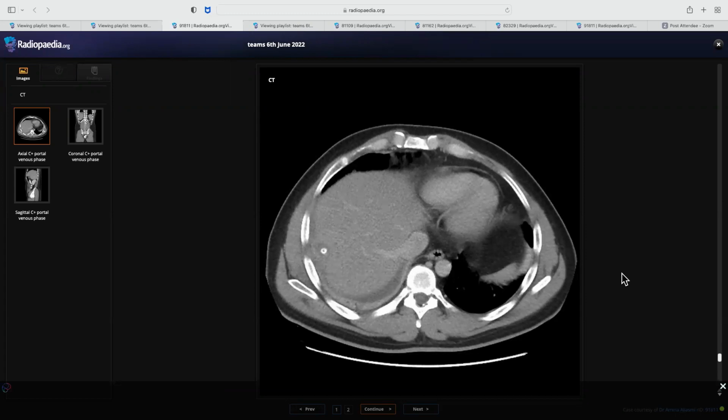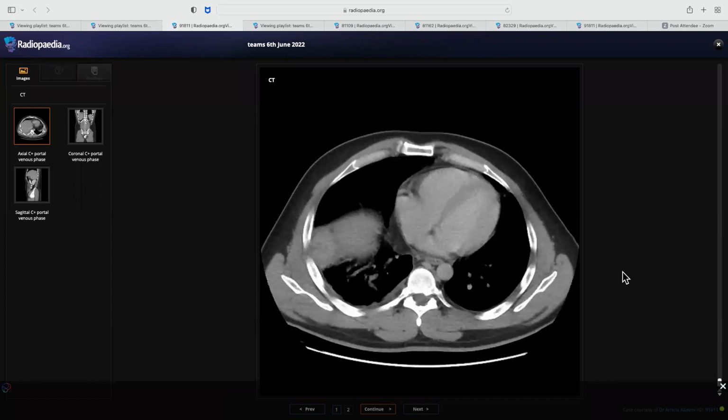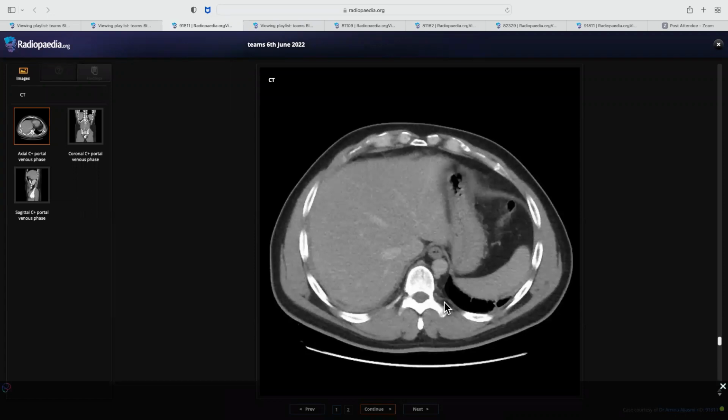So it has an infection. Do you think it's a long structure? In how many sections could you see that? Can you scroll it? You said it's a port catheter. That's what I heard. Part of a tube or catheter. Yes, part of a catheter. Okay, that is one possibility. You can see the coronal images also. Coronal, okay.